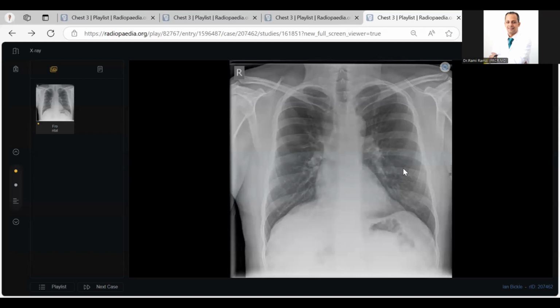Looking at the radiograph, I can see the bilateral hila appear prominent. The apices are clear. I can see there is an opacity noted at the right paratracheal region. It is an ill-defined opacity in the right apical region and it is not effacing the paratracheal region, so I think this is in the lung. Apart from that, bilateral hila appear prominent.